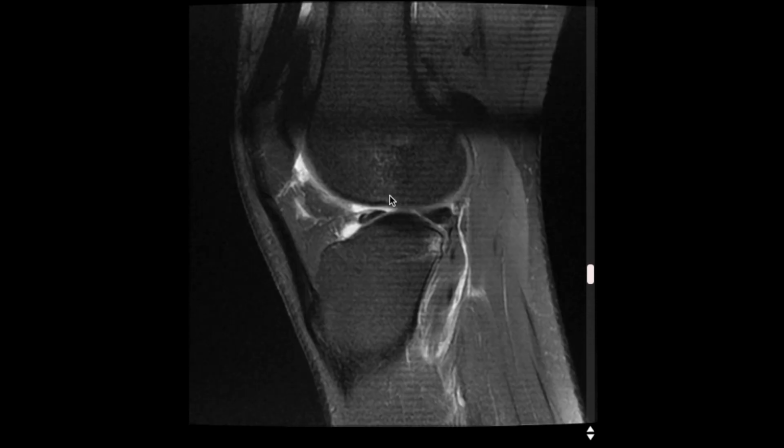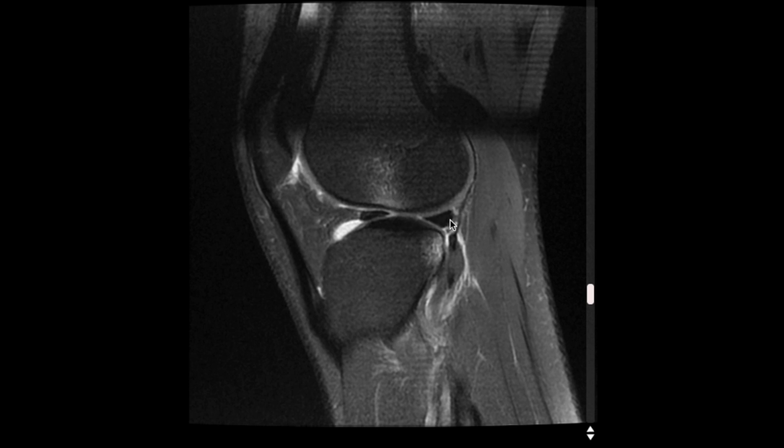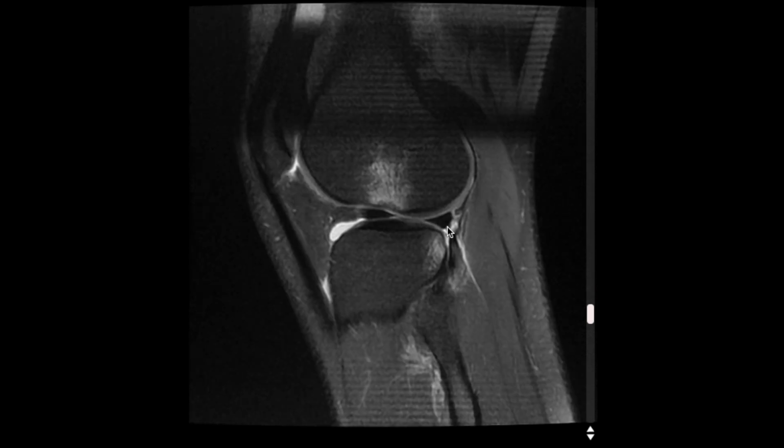As you continue to scroll laterally, you're going to again encounter the black triangles that you're looking for. Those are representative of the lateral meniscus, which you'll be looking for a tear as well. Since I don't see any white lines coming through, then I don't think that there's a tear seen within the lateral meniscus. Another associated finding is a bone bruising pattern that would be consistent, most likely, with an ACL tear.